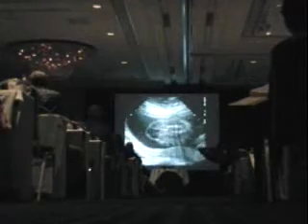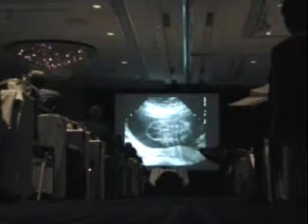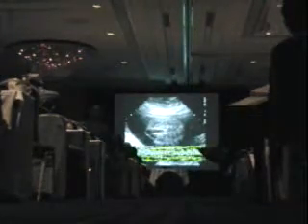Here's another one. Now this one, you can see the large sac back here. You can actually see the defect. Whoops, this is not happy. Okay. I'll just bring it up again. That clip's been giving me trouble here. And we're going to go down to, let's see. We'll go down to this one.